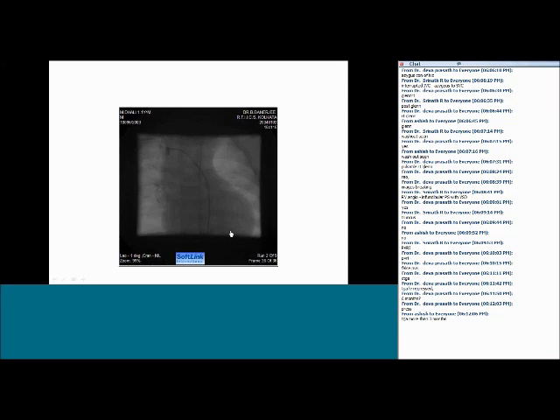Any guess in the diagnosis in this patient? No. Okay. The second, Ashish, you are very close, but you need to add some adjective to your diagnosis.